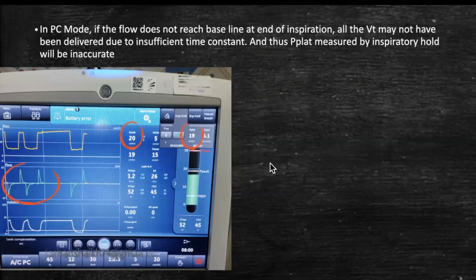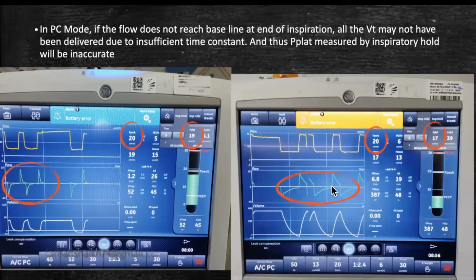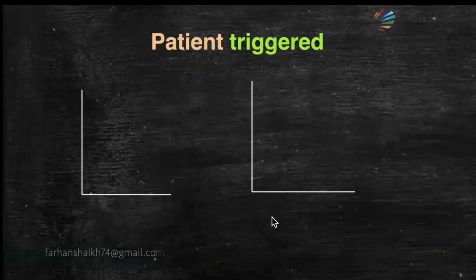But suppose you have a situation where your inspiratory time is not sufficiently long, your flow is not touching the baseline, and you are entering into expiration. In this situation, if you are applying an inspiratory hold, then you will see there is a significant difference between PIP and P plateau. Plateau pressure is shown as 17 and P peak is actually 20. So there will be a discrepancy. That's why you need to apply inspiratory hold ideally to check the plateau pressure, or make sure that your inspiratory time is sufficiently long so that decelerating flow touches the baseline and then expiration starts.